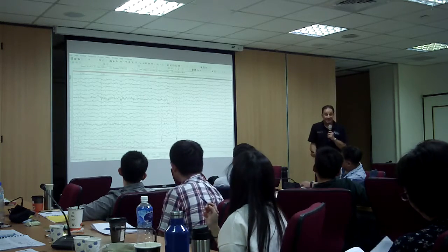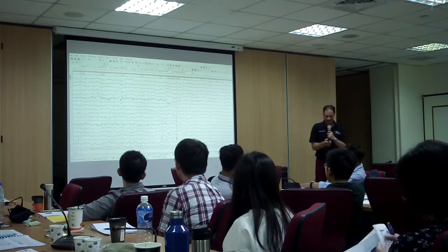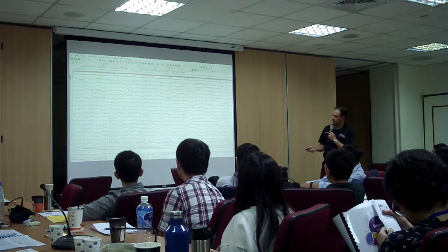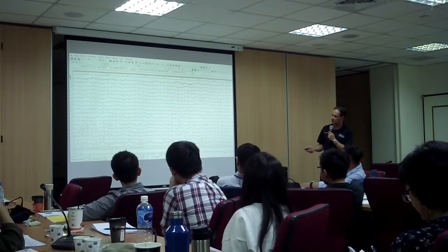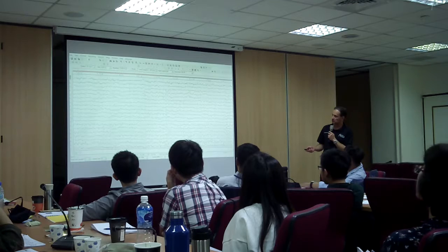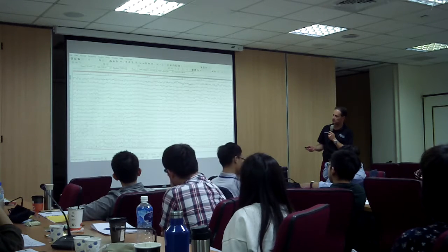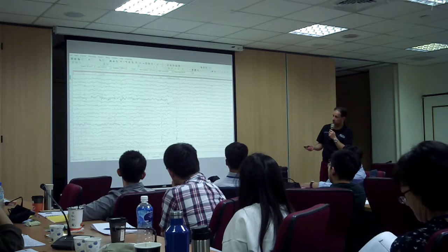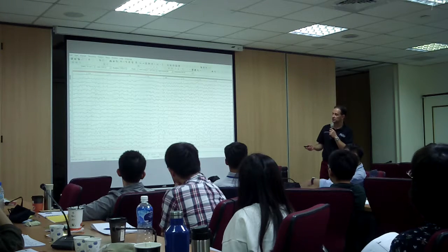I know what it is. Got the neurologist going, I know what it is. So, what do you think it is, people? And there it is again. Any ideas? No clue? So, what is it? The same. Another epileptic discharge.